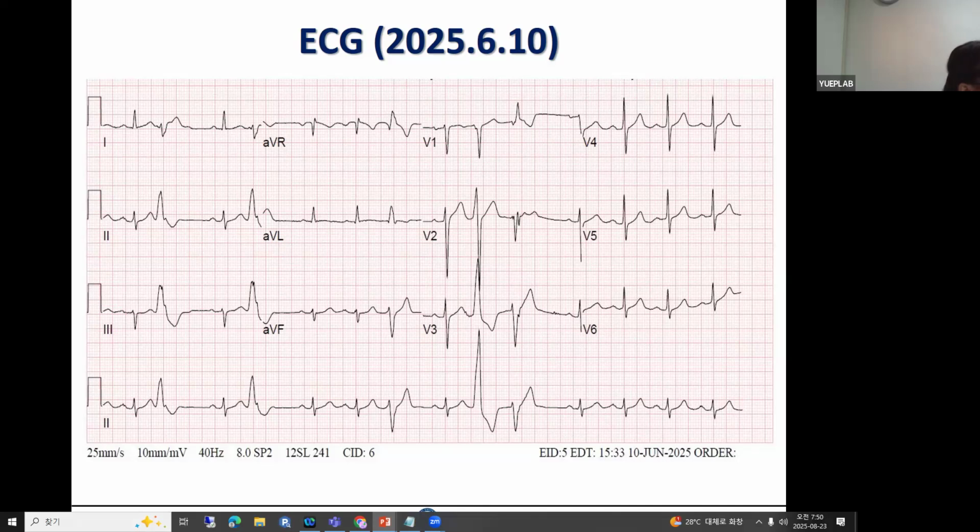And my curiosity is the third PVC, the V1 to 3 second PVC. It has a relatively sharp RBBB morphology, a short intrinsic deflection time, and fractionation in V2 and V3, and lead 2 shows a negative wave. So it could be the left side posterior septum. It is a little far away from the other two PVCs.